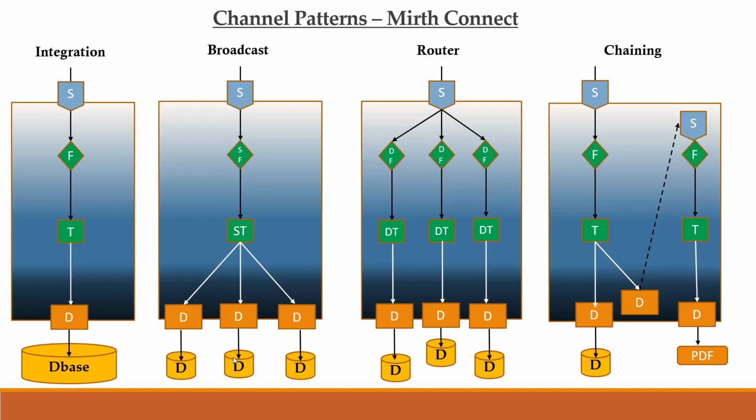Now in the second scenario, let's say that you are sending the data to a TCP/IP connection. So you'll receive an acknowledgement. Their validation comes into play for sure. Once you deliver the message to the destination, the destination will respond back to you with an acknowledgement message, and that acknowledgement message can be validated on the destination side to say that, yes, the message is successful.